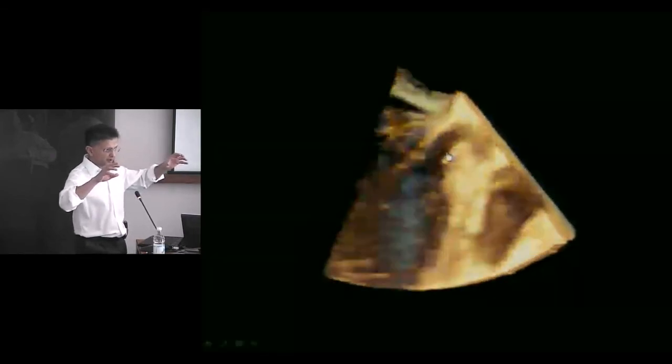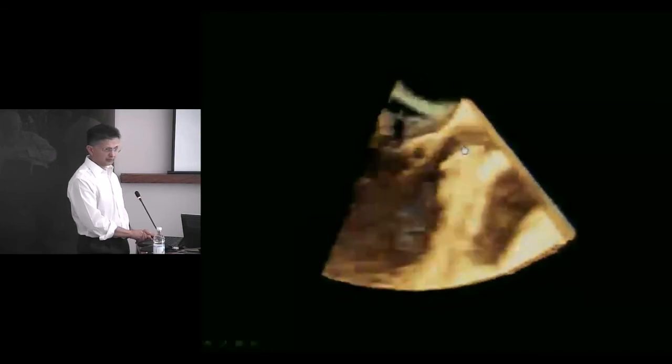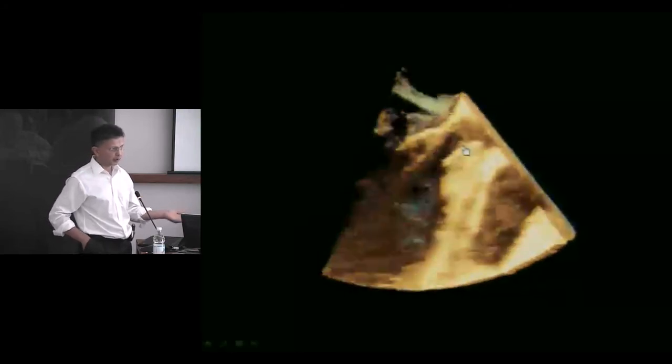They're important. They typically attach between the hinge and the tip, and they're important support apparatus for the normal mitral valve, especially the anterior leaflet. But in this case, this was just proving to be a very big problem for this guy. So our surgeon went in and he cut out all of this. He found this exactly where we suspected it was going to be, cut it out, and that pretty much took care of it. And we were pretty sure that this was not going to result in mitral regurg because it was not a primary cord.